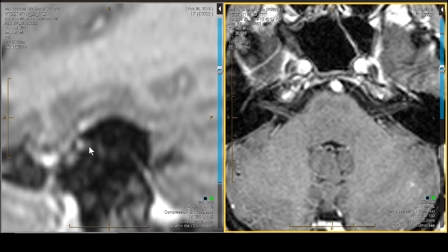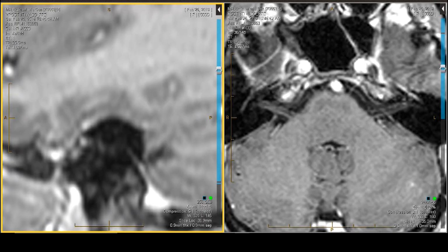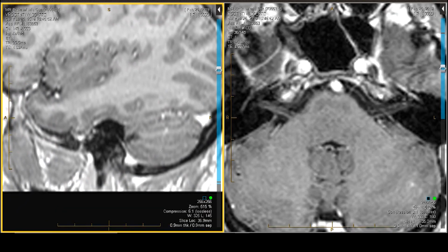Now if we try and cross-reference the geniculate ganglion, which is our second point of interest, the geniculate ganglion is right here in the sagittal projection. This is a magnified sagittal view, so this would be anterior, this would be posterior. I'll minify it a little bit so you can see where you are. So here's the cerebellum back here. Now it's really hard to see the ganglion, but you can see what a challenging structure it is to see.